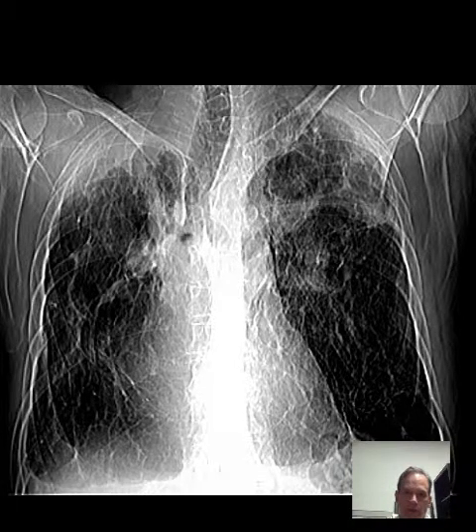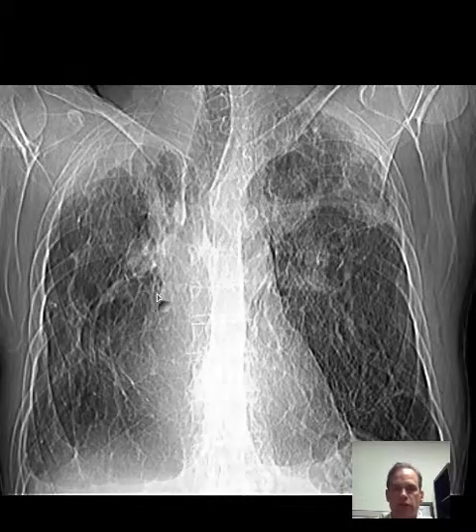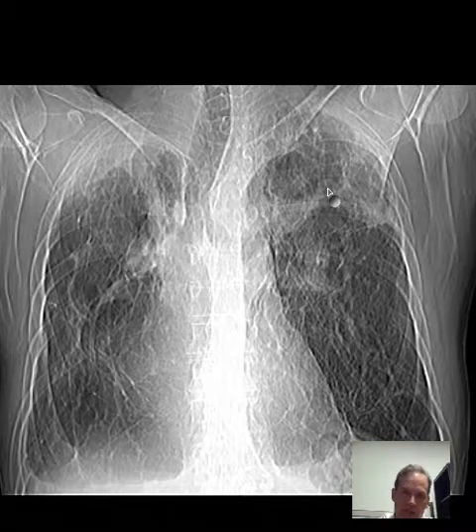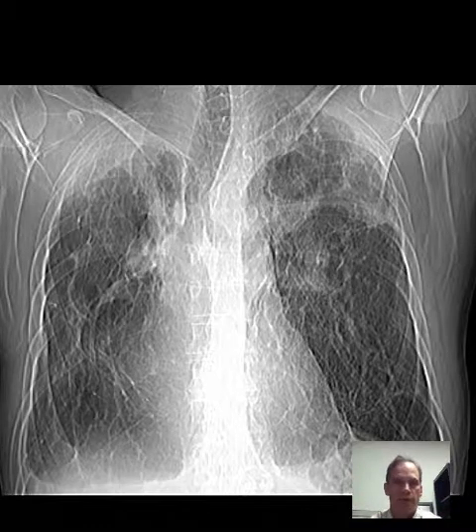They're pulled up. That's called hilar retraction. So look at it here on this kind of chest radiograph image. You can see the apical pleural thickening, which is most pronounced on the right. You see a band of fibrosis here. You see areas of linear fibrosis coming from this apical area toward the left hilum. And what's happening is the hilar are actually being tethered by those fibrotic changes and pulled upward.